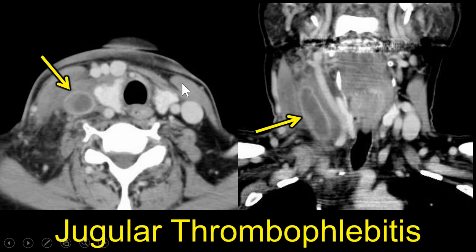On the contralateral side, we see the normal sternocleidomastoid muscle, the internal jugular vein, then the common carotid artery, then the thyroid. Here we see the trachea airway, so we're below the cricoid, and here we see the esophagus posterior to that. Here's the right lobe of the thyroid, then the right common carotid artery, and then here's the jugular vein.